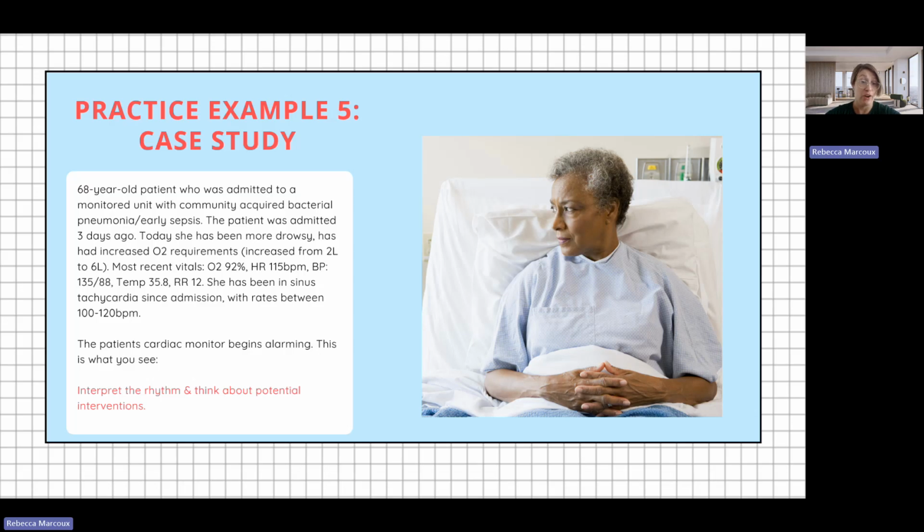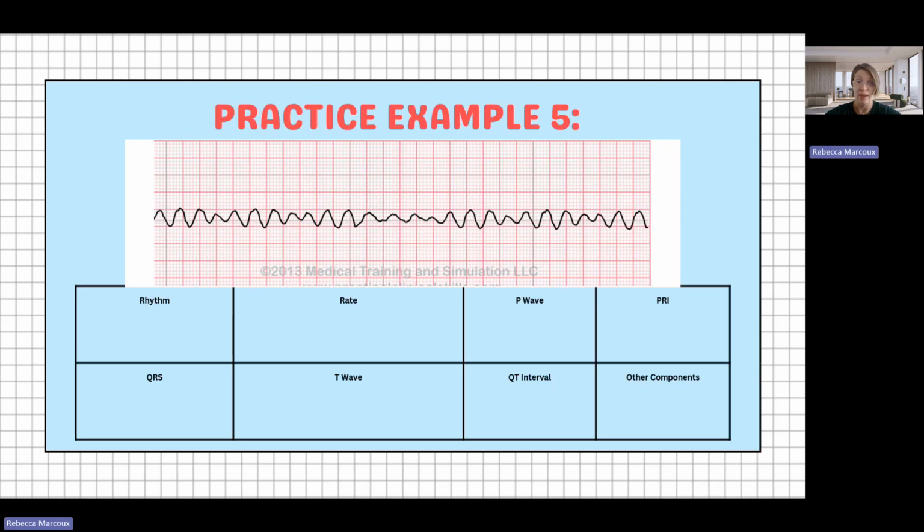So the patient's cardiac monitor begins alarming, and this is what you see. So again, if you need a second to think about what this is, pause the video. I'm going to move on to our interpretation.